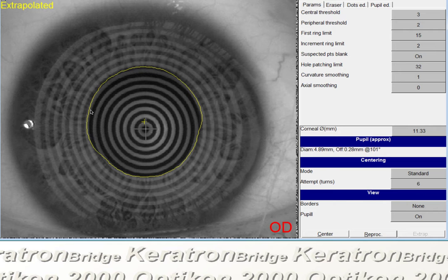And then what you can do is at that point import the baseline files that you had uploaded for the clinical support. That will include the baseline topography as well as the 2 lens designs that are made already, and it'll be under the original name. You can tag that now with a designation if you like, but it'll be different. You'll have in effect 2 files for the same patient, but it'll have both the old and the new available to you in case you want to look back.